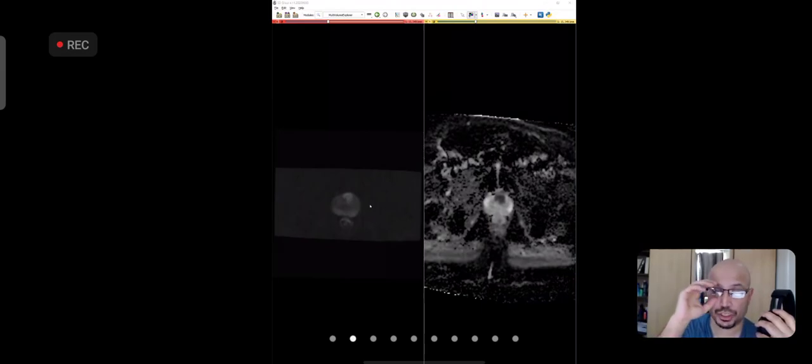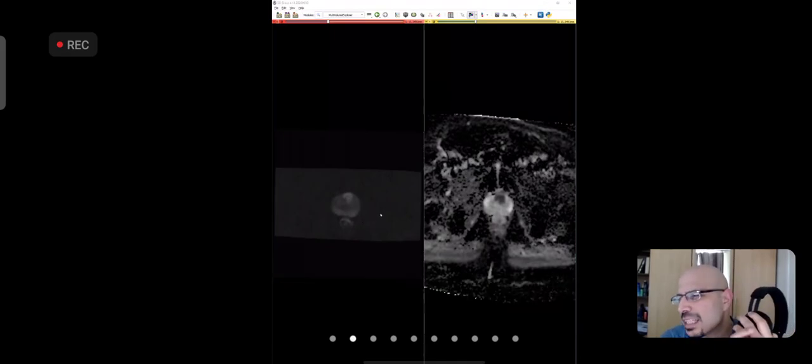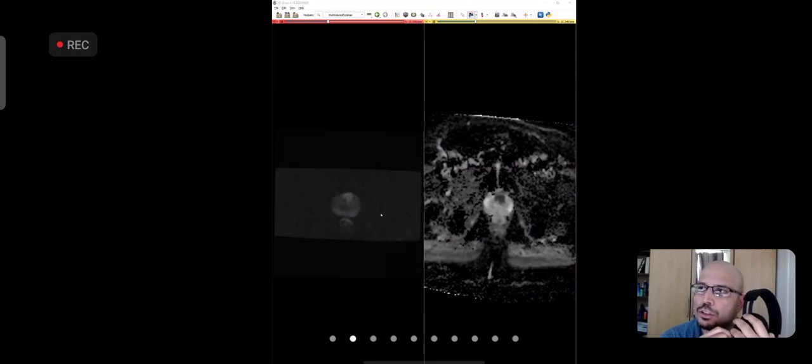As for peripheral zone diffusion weighted imaging, let me say one thing. First, you should not say that the diffusion weighted signal is high and the ADC map is also high. You should be practiced enough to make one interpretation by looking at all of it. Okay, that is the first teaching point.